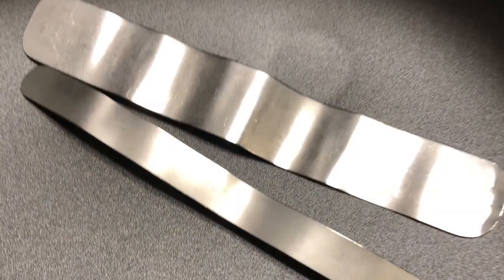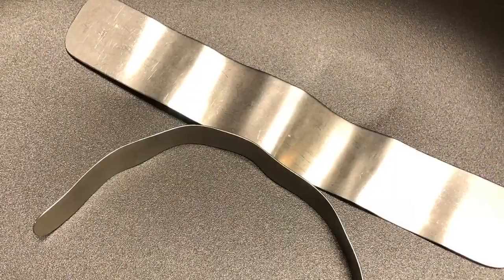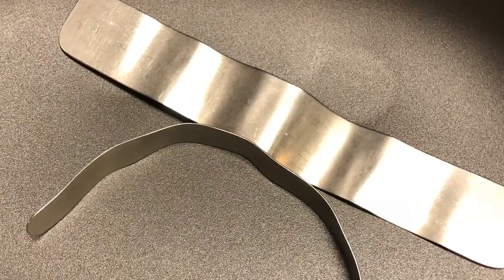The malleable or ribbon retractor. This is similar to the Deaver retractor, but it can bend to fit the area to be exposed.